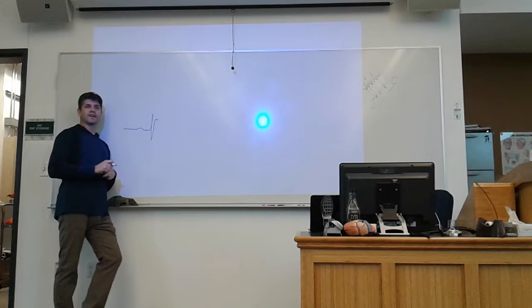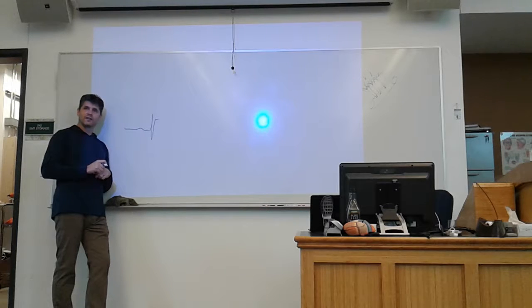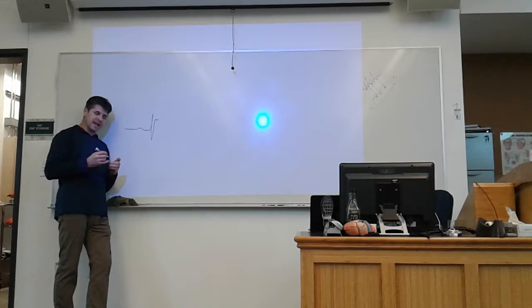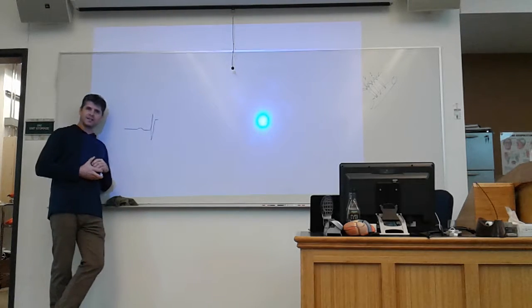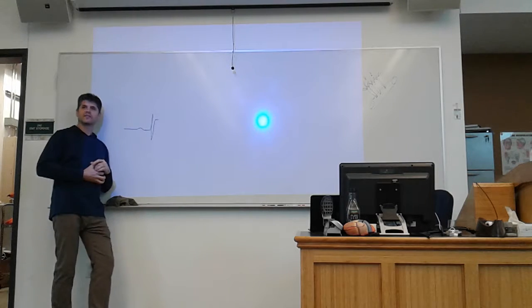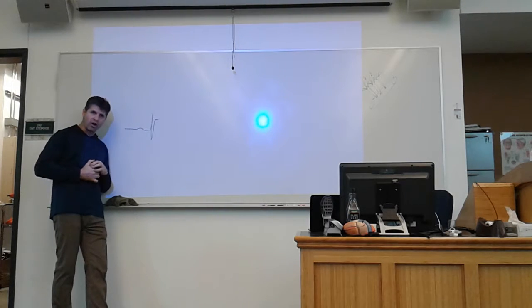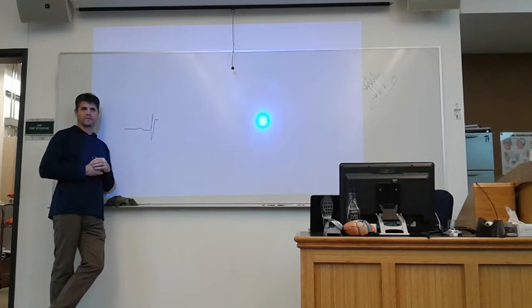But the level of ST elevation is related to the level of damage being done. And this is damaged tissue. It's not dead tissue yet, but it is tissue that is not using ATP pretty much at all like it's supposed to.